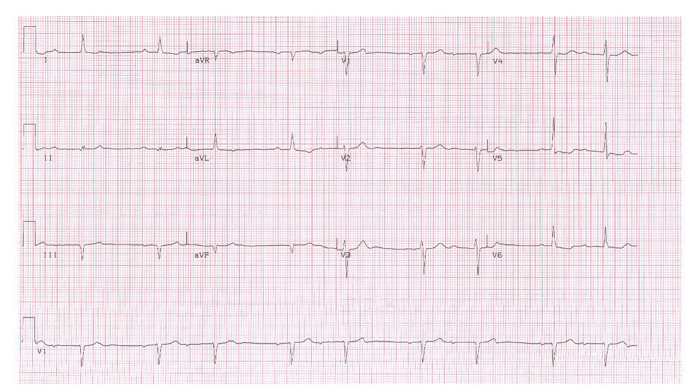Let's now take a look at this full 12-lead EKG with an included rhythm strip and try to figure out what's happening with the rhythm in this situation. So at a first big glance, I can see that my rhythm is irregular. We've seen this EKG before in part 1. We determined the rate at that time to be about 54 beats per minute, so a little bit slow. And we've also identified that this EKG has a rhythm that is regularly irregular, meaning that it has a pattern to it. So now we need to figure out why this rhythm is regularly irregular and what's happening.